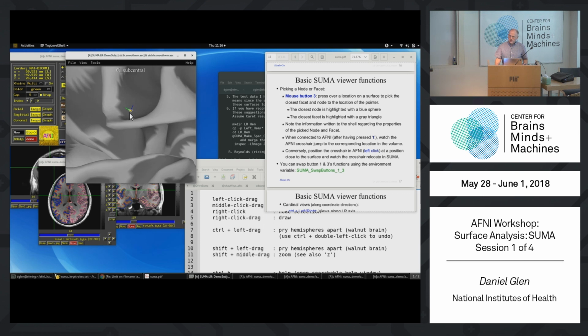Right click. Yeah, it depends on the version of the OS too, which one it is. Usually it's the right click, but it depends on your mouse configuration. And some of these things you have to either disable Mac shortcuts, or even Linux can override some of these things too.